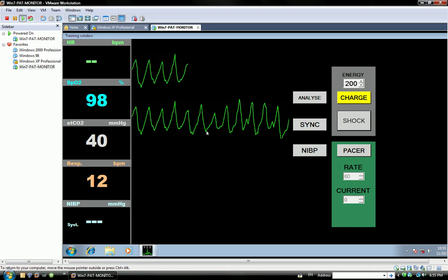If you want to perform CPR, you have to press a bit more or even harder. The BPM for most medical regulations, which is the American Heart Association and the British Red Cross, according to these websites, the minimum CPR BPM must be a minimum of 100 or even 120 BPM.